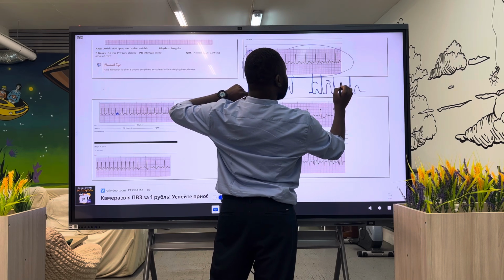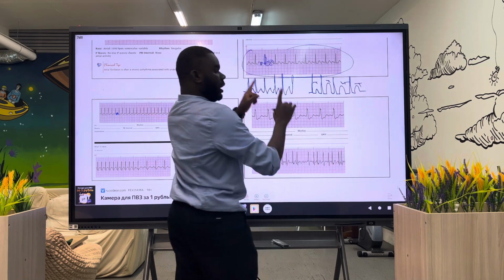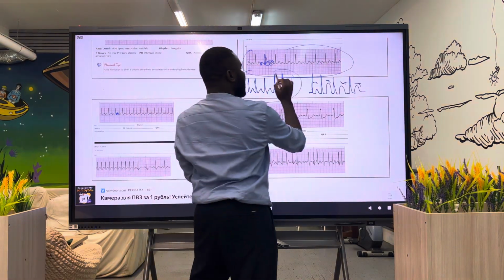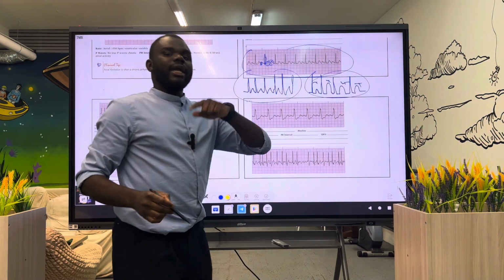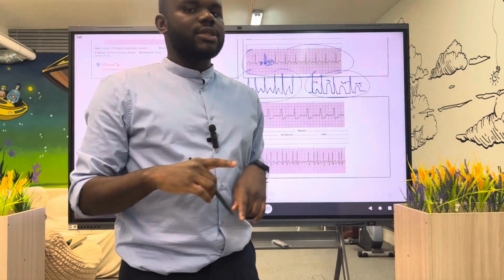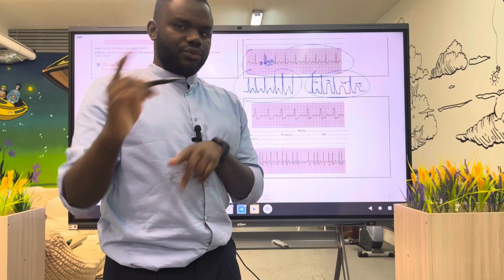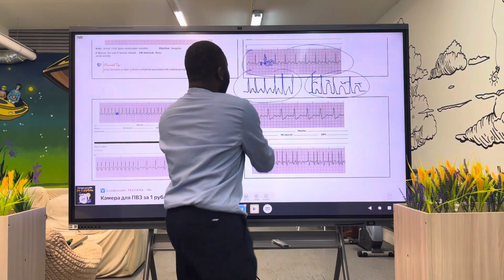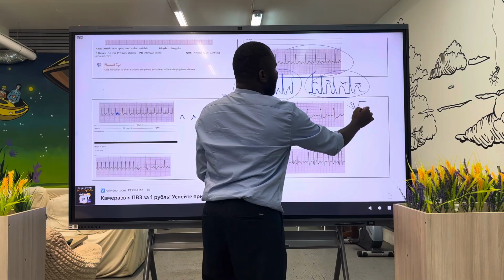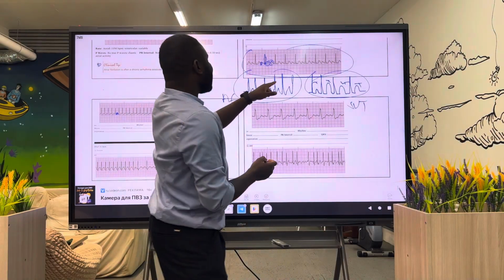Just a T wave in between all the RR intervals. T wave in between the RR interval. So this picture and this picture look alike. In my previous video, I was saying we use a certain substance to differentiate, diagnose and treat whether it is a flutter or SVT, which is adenosine, because we can't really differentiate.